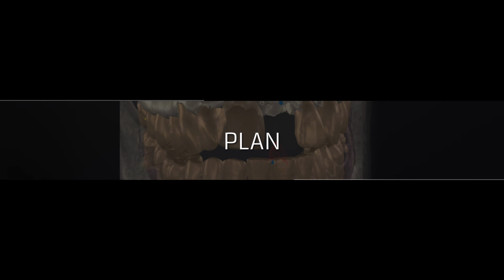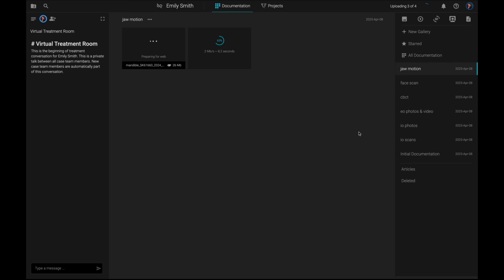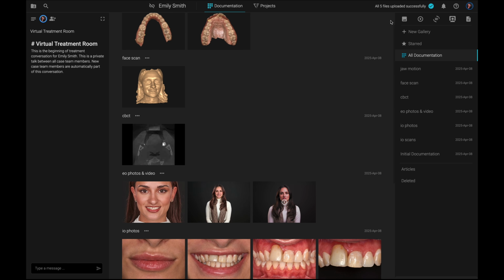The second step focuses on creating a digital avatar of the patient for treatment planning. This requires us to upload and merge all gathered information from the first 2 clinical sessions onto a cloud-based communication platform such as SmileCloud. The avatar is the foundation of our detailed and comprehensive treatment planning approach to follow.